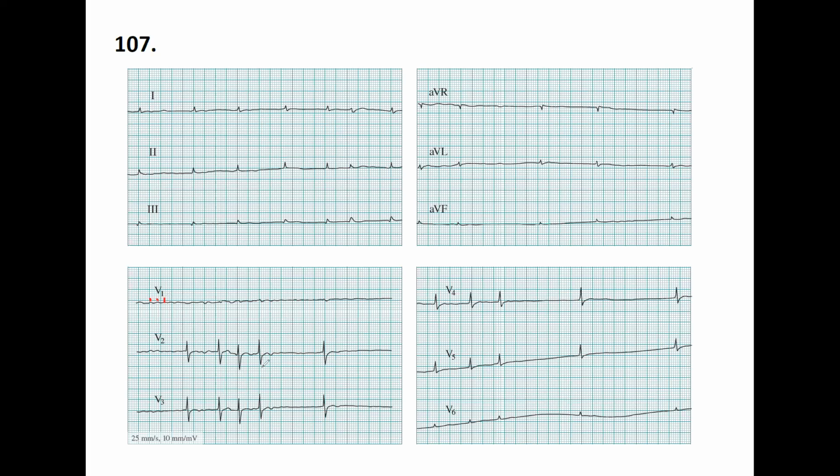The easiest one to recognize in atrial fibrillation is arrhythmia absoluta, because there is no rhythmicity at all. Arrhythmia absoluta, no P wave, atrial fibrillation immediately, but that's next week. Now, who has 107?